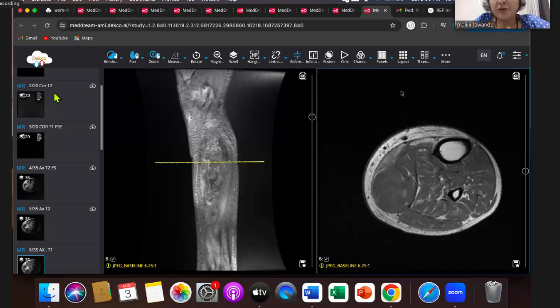Different variants of soft tissue sarcoma. If you're seeing myxoid areas, you may say so. If you're seeing the tail appearance, you may say so, but it's not necessary. It's perfectly fine to call it a soft tissue sarcoma, but describe all the extent. That is very important.